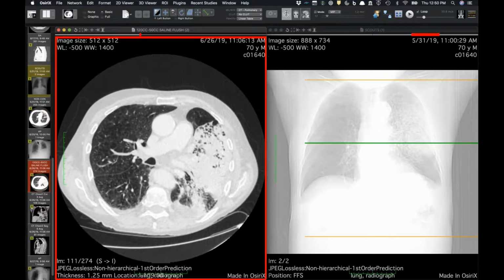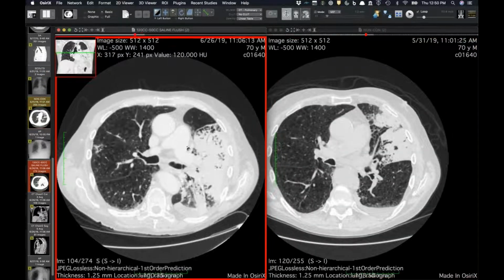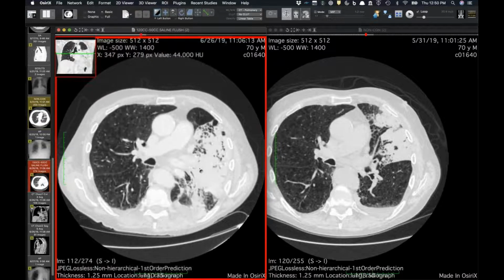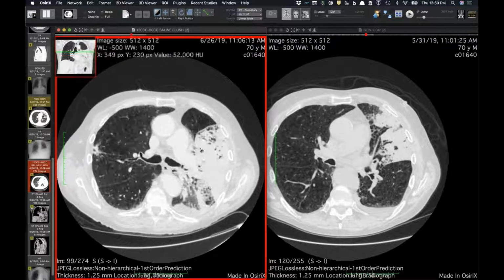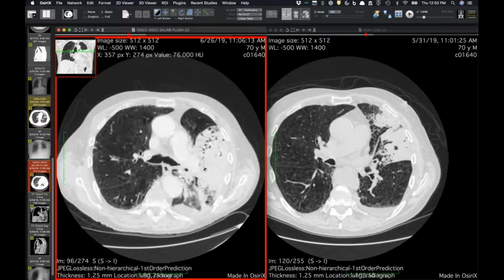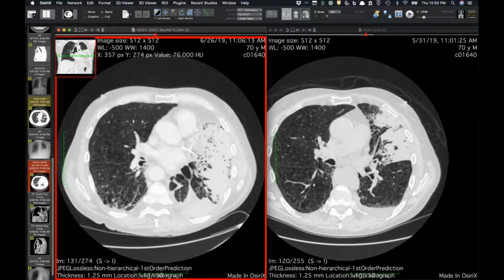what had happened. When you compare the CT, you can see how there's still consolidation, and if you follow the airways, it's still the left upper lobe, but of course the left upper lobe is no longer where the left upper lobe belongs. And I'll show you the sagittal in a moment.